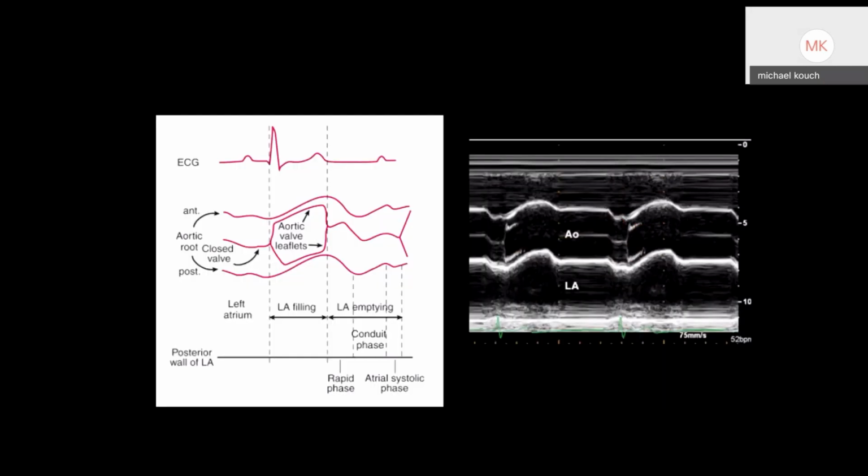All right. This is just a little bit easier rendering of everything that we're finding, right? So the anterior wall, the posterior wall, and this is where all the magic happens, looking at the aortic valve. Okay. So I like to think about these as simplistically as possible, because if you don't think about these simplistically, the images can get really hazy and confusing, and you can kind of just give up on the question right away. But if you go through it in a systematic process, you're going to be able to figure out what's abnormal in that picture. And you should go through it systematically, like reading an EKG. You should read M mode like that with every patient as you're doing your scans.